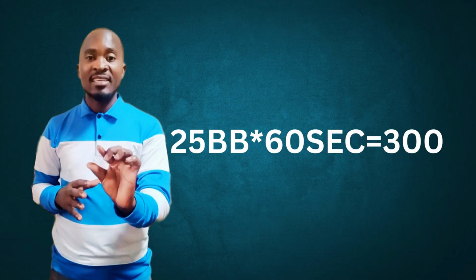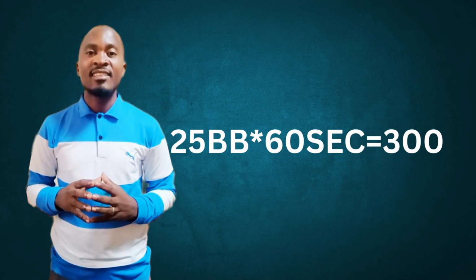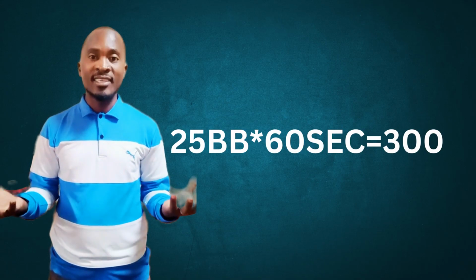We multiply that by 60 seconds. That would be 300. And that is why, if you're using the big boxes to calculate the heart rate, count how many big boxes there are, then take 300 divided by the number of big boxes. That will give you the heart rate.